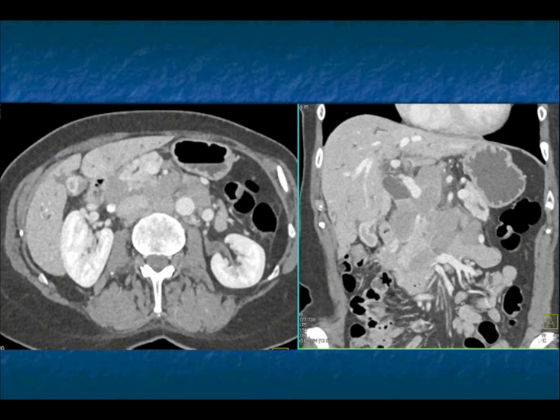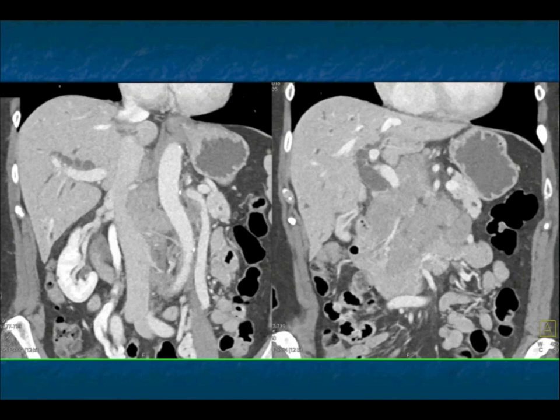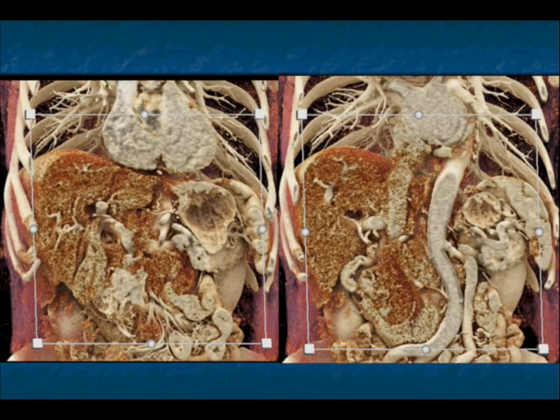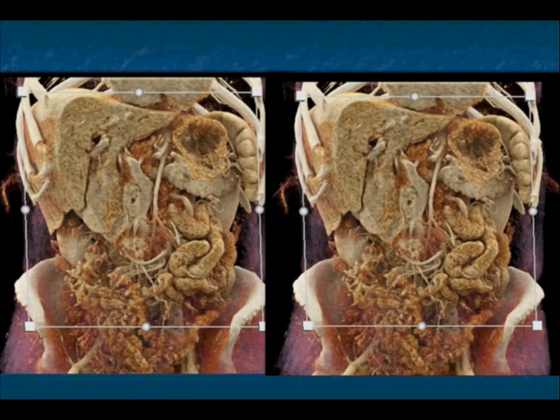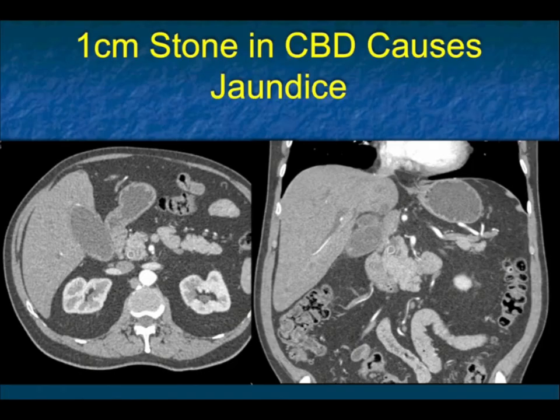I mentioned a few moments ago, pancreatic cancer does have nodes, peripancreatic, mesentery, omentum, but the nodes usually aren't very bulky. Here, these nodes are very bulky. When I think bulky nodes, I've got to make sure I'm not dealing with lymphoma. Here it is with vessel encasement and really impressive adenopathy. Here it is on the cinematic rendering with the nodal masses, the infiltration around the vessels. And you could see why it could be confused with a pancreatic tumor and a pancreatic primary, but obviously that's not the case.